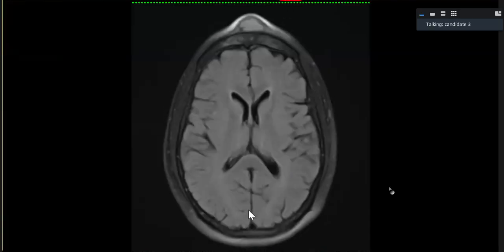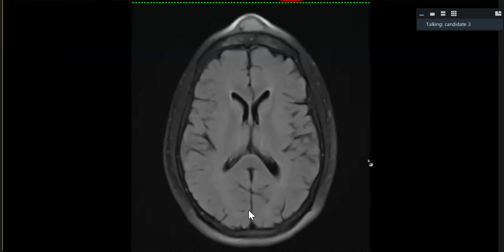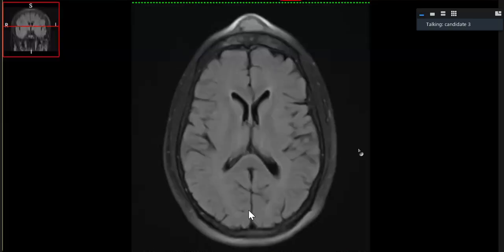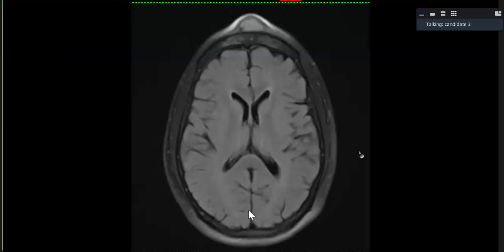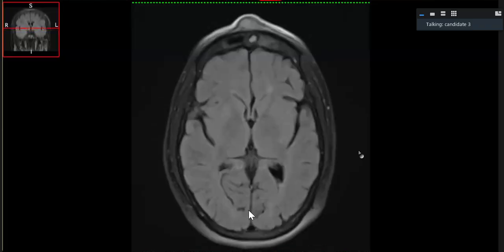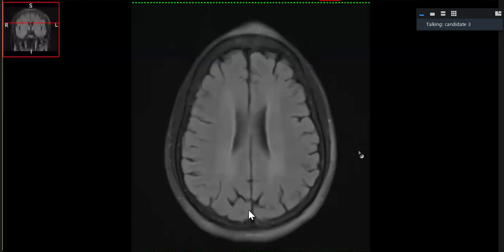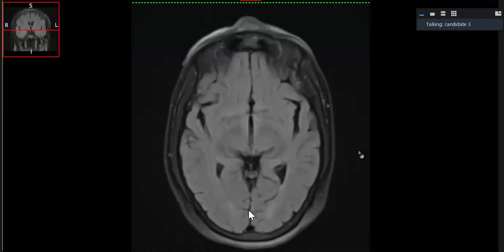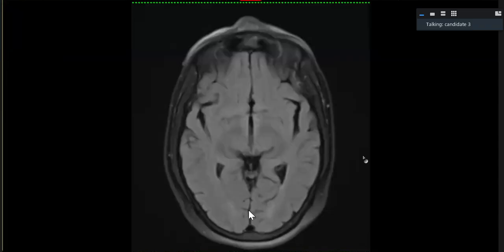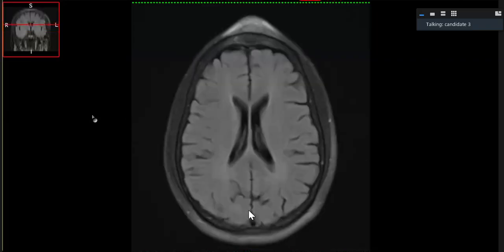I can also see a midline FLAIR hyperintense, well-defined lesion in the scalp, anterior to the frontal bone in the midline with overlying bulge. The underlying frontal bone is showing hyperintense edema signals, and the left frontal sinus is also fluid opacified. I cannot see any definite bone defect in this image. In my routine practice, I will also review any CT brain available or bone window to look for changes in the underlying bone or any defects.